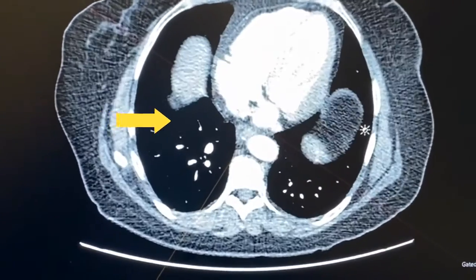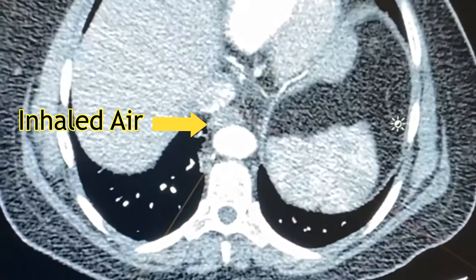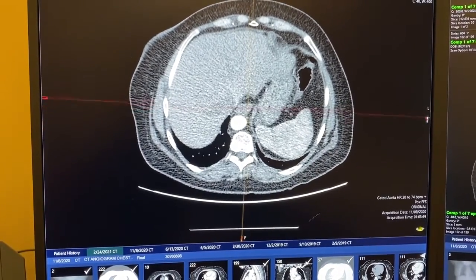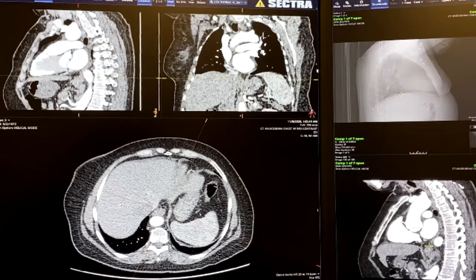So to actually measure the HSA, I had to first learn the basics of radiology and multiplanar reconstruction. To find the hiatus, I had to first find the esophagus, and a dead giveaway for the esophagus is that it's the only structure that contains little black spots in the chest, and these black spots correlate to air that the patient has inhaled during surgery. So if I find these black spots and follow them down the body, I will eventually be led to the hiatus. This is a multiplanar view of the abdomen.